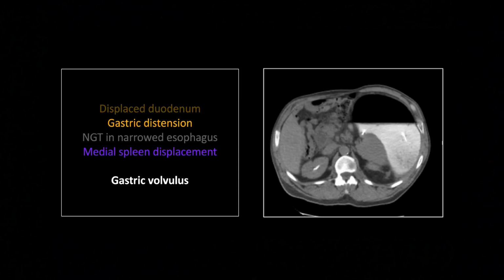So this is a surgical emergency. These volvulus stomachs will get ischemic very quickly. This is one of my favorite findings. There's the stomach dilation again. There is the displaced spleen. If you think about spinning the stomach on its mesenteric axis, it can drag the spleen with it.